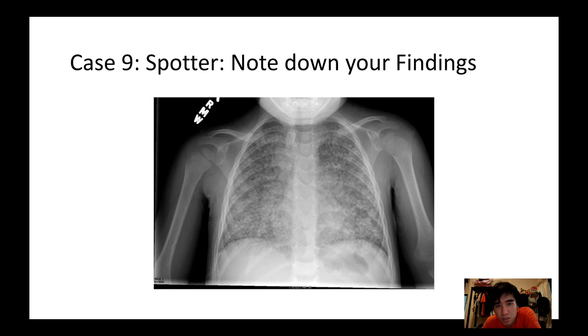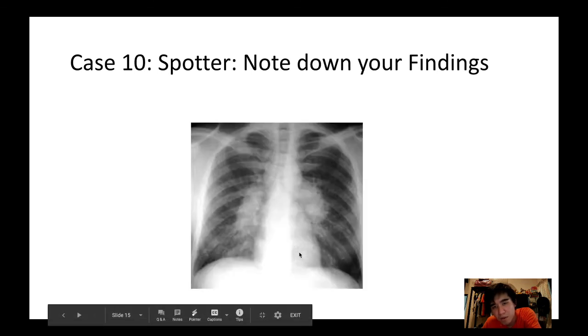This one looks like a pediatric chest x-ray. It's miliary. Looks like miliary TB, however. In pediatrics, there might be another condition which may look like this. I don't know. Don't know what's going on here. You tell me.